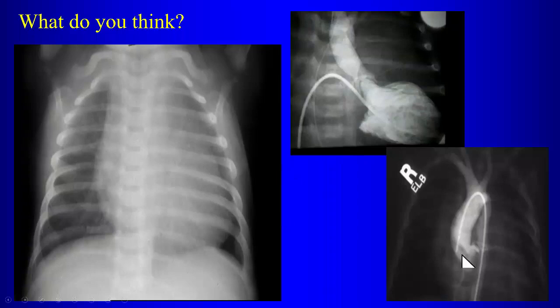And also, what is this here? See, the injection is in the ascending aorta, and this is a jet coming out from the left ventricle into this, right? So your diagnosis here would be what? Stenosis? Yeah, so this is aortic valvular stenosis. Also, the size of the ascending aorta, right? Notice that in the ascending aorta there is a little bit of poststenotic dilatation.